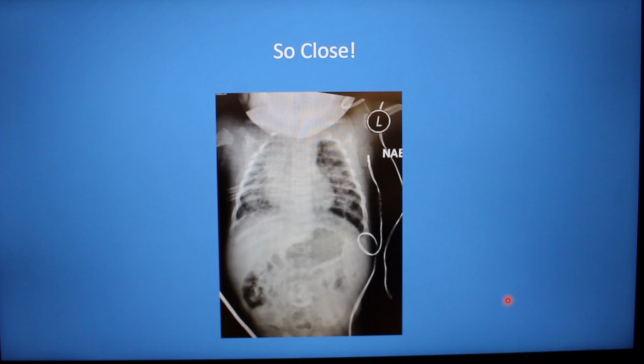For example, looking at this baby, you can see this is an old preemie. He's got very chronic lungs. He's well inflated. He's obviously on high flow, but he's got these chronic kind of patchy areas showing some lung damage, scarring, inflammation. This is typical for an old preemie.